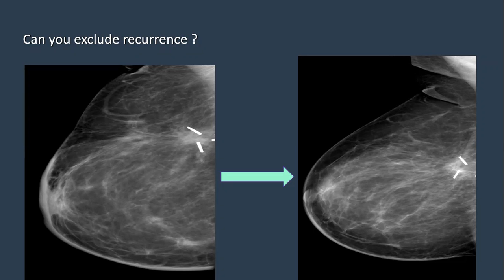I have to consider it. I am looking at the asymmetrical site of scarring. If the density is increasing, it will be alarming. If the size is increasing, it will be alarming. If there is spacing of the sutures, it will be alarming, so there is a mass effect going on. Regarding the calcifications, I am also going to look at whether the calcification is being displaced. It will be the same.